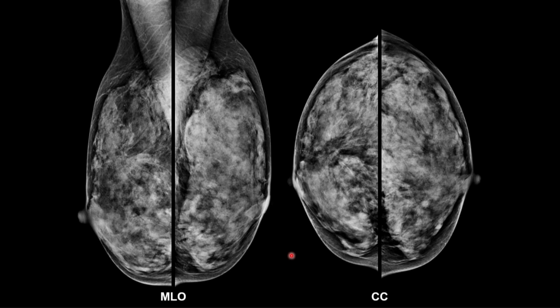Yeah, so I did notice the round finding in the medial left. Aha, see, now we got a third lesion. Medial left, that little round finding that you were working up. But during your workup, with so much dense breast tissue, even though it looks like it resolves on the repeat view and the spot mag, I think I'd be too scared to not do an ultrasound on top of it and just let it go. Again, only because it's such dense breast tissue. And of course, we probably would have had 3D.